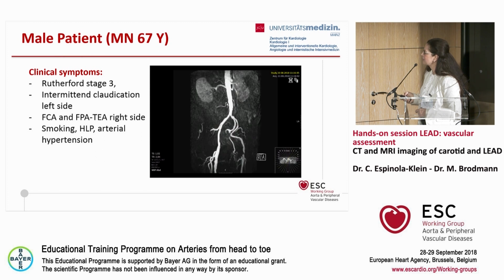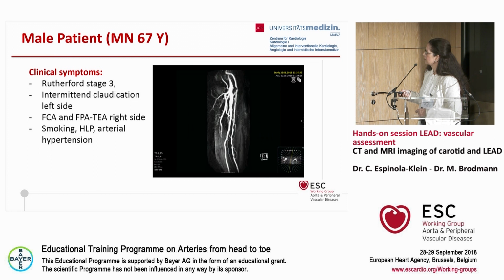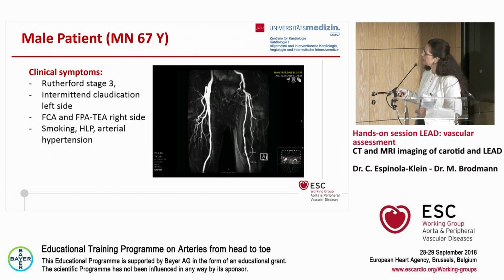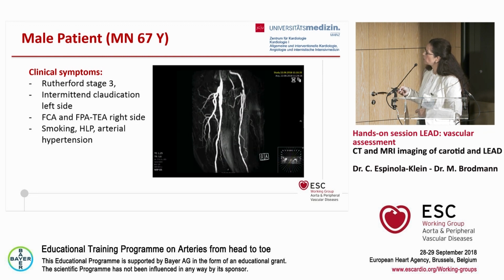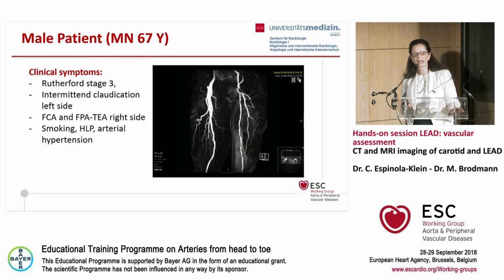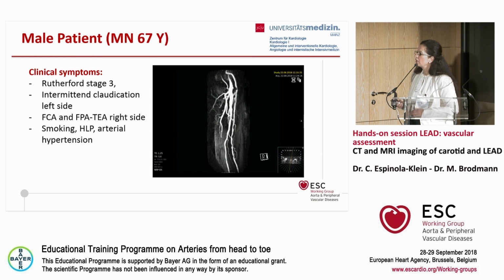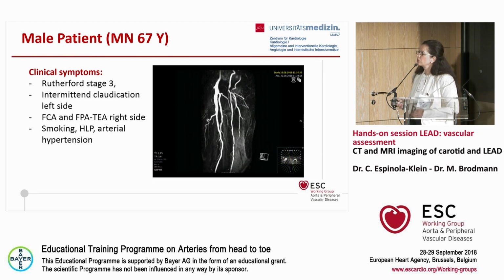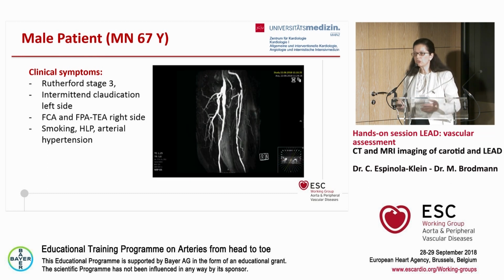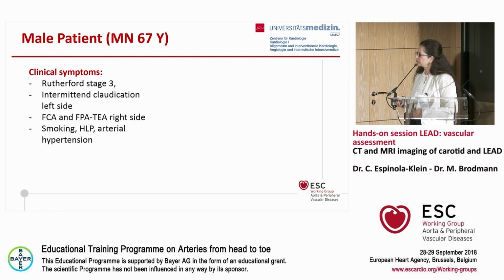So the next moment. He had already, yes. But as you can see here, we have in addition, and we see it also in ultrasound, additional lesions in the superficial femoral artery. So we discussed in our board a hybrid procedure to perform operation of the groin, and in the same procedure an intervention of the superficial femoral artery.